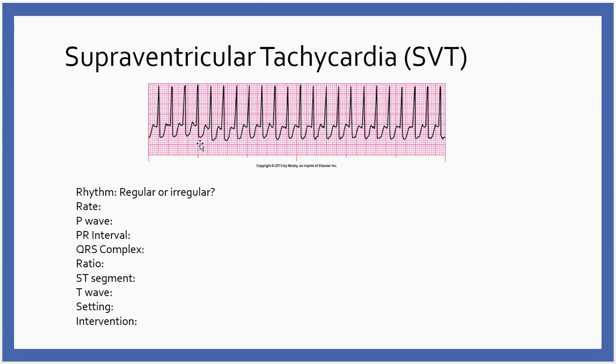I can't tell whether this is ST segment depression. It looks likely, given the fact that the heart rate is so fast, that the patient's kind of ischemic from that. So, setting. Now, this can be a finding in healthy as well as diseased hearts.